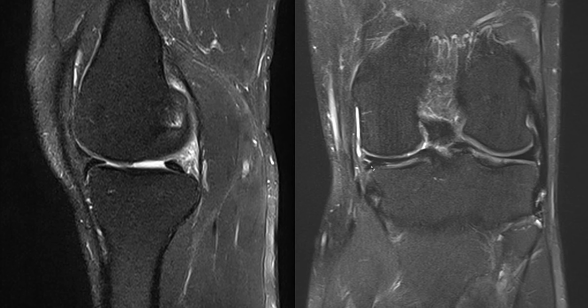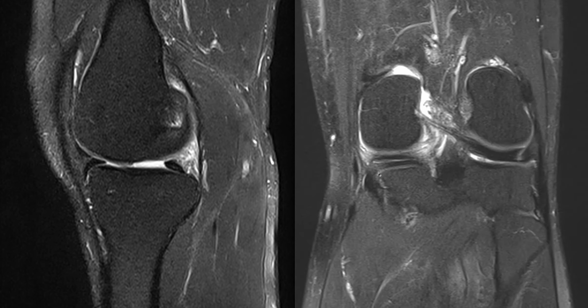Now sometimes if these fragments are very small, they can be difficult to differentiate from surrounding meniscal attachments. But here we can see the two components of the meniscus with the horizontal tear in between, and a third component as it extends around the tibial rim.